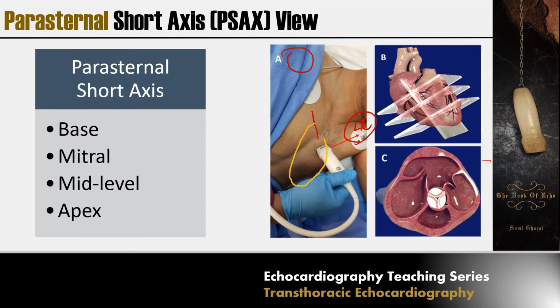By doing this, the heart is somewhere like this. Now, instead of cutting on the long axis of the heart, you will cut in a short axis way of the heart. So it will be short axis cuts of the heart.